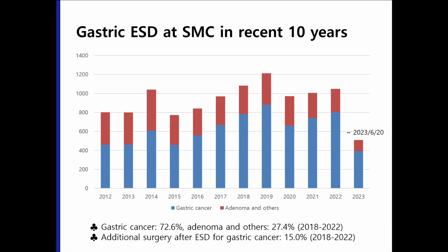At my institution, Samsung Medical Center, gastric ESD is done in about 1,000 cases a year. In the recent 5 years, the rate of gastric cancer among ESD cases was 73%. The rate of additional surgery after ESD for gastric cancer was 15%. For the selection of ESD candidates, endoscopic assessment of early gastric cancer is so important.